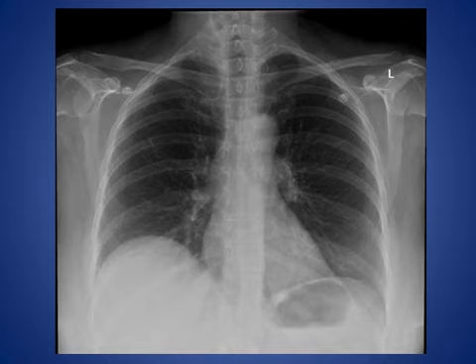And this is congenital in nature and due to incomplete muscularization of the diaphragm with a thin membranous sheet replacing the normal diaphragmatic muscle. Over time, this stretches and on inspiration does not contract normally and usually affects the anterior medial portion of the right hemidiaphragm.